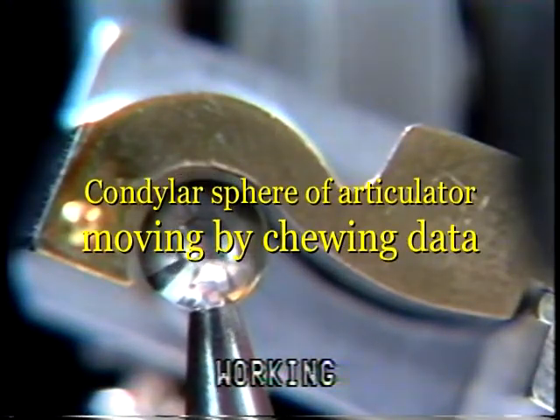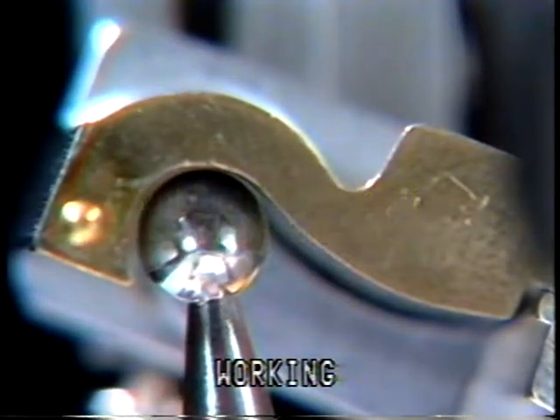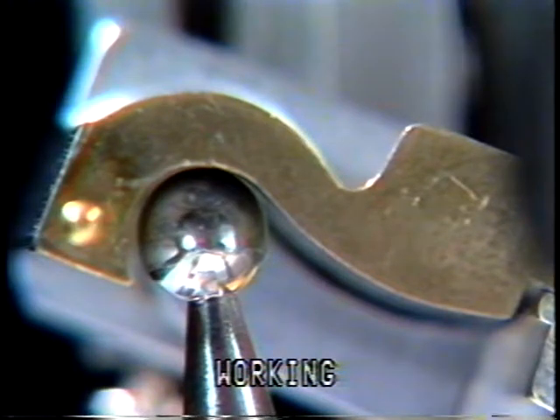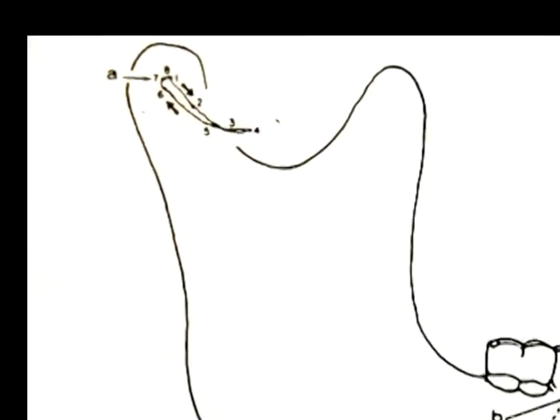The articulator itself was mounted in the replicator, and its lower member moved by the stepping motors, which were driven by the chewing data stored on magnetic tapes. On the working side, the condyle follows the eminence on opening and often returns on a slightly inferior course, as shown in this single working side chewing plot.